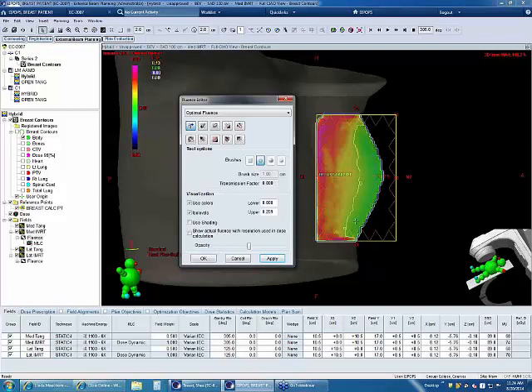Now there's 2 ways that you can extend your Fluence. I shouldn't really say extend your Fluence. In the Fluence editor, you can paint dose outside here, taking the values from inside here where it's green. If you click on your measure transmission factor and click around in the green, you'll see it updates in the transmission factor 0.104, 0.99, 0.103, 0.105. It's updating around here 0.109. You could, and as high as 115, you could select a brush and then just come in and paint your dose outside here, and that would be enough to get the leaves off of the body contour.